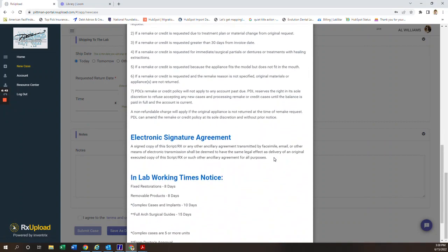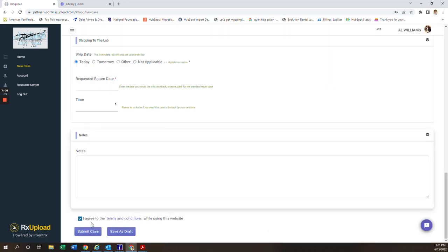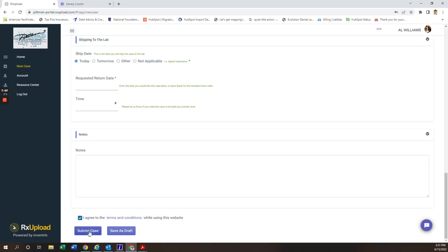and then you can now submit the case. If you've got more information to add later, you can submit it as a draft and go back in later and finish it and then send in the case. So we'll just create a draft for this one. So if you come up here, you can see that it now appears in our list of cases, and it's marked with the status of draft. So later, if you want to go back in and finish, you can just click on draft, then edit any of the information in the Rx.